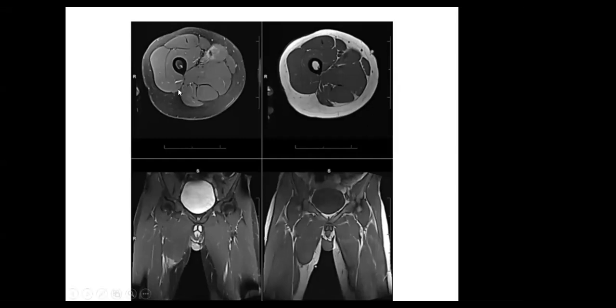Remember in the soft tissue tumor lecture, we talked about the compartmental terminology. On the thigh, you have the quadriceps, you have hamstring, and you have the adductor compartment. This muscle here doesn't really belong to the adductor. Sartorius muscle. Well, sartorius is here actually. This is the gracilis. Sartorius covers the vessels.